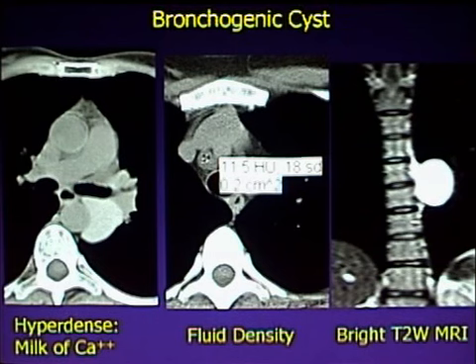They can be quite small sometimes, such as we're seeing here. This one is in the perivascular space. Sometimes these occur right behind the heart, and they can be confused with a small pericardial collection associated with the superior pericardial recess behind the aorta. But in fact, if you look carefully, they don't hook up with the pericardium. This one's reading 11 Hounsfield units, very typical.